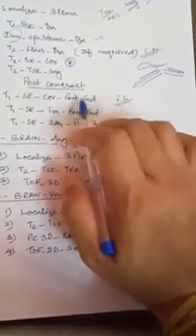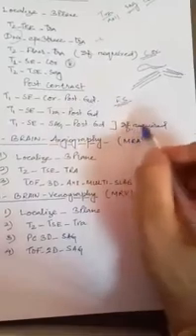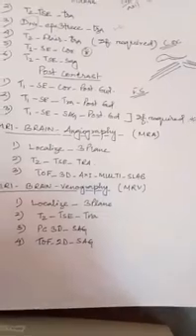So after giving this gadolinium, we are using T1 coronal, T1 axial and T1 sagittal. Sagittal only if required. Otherwise T1 coronal and axial we must take. But remember one thing, these will also be the spin echo sequences.